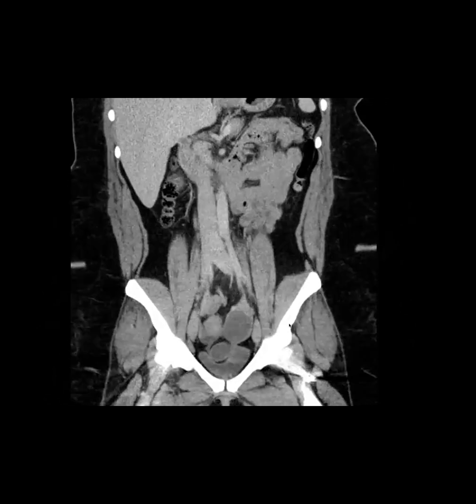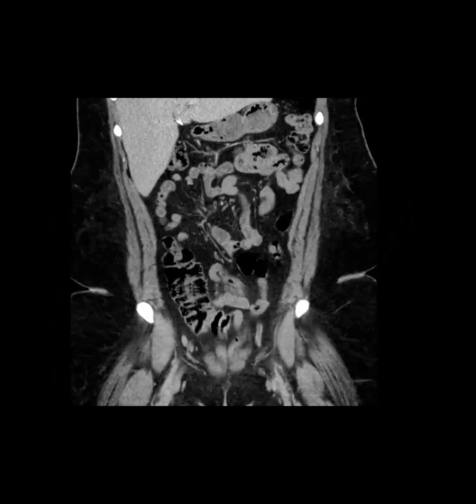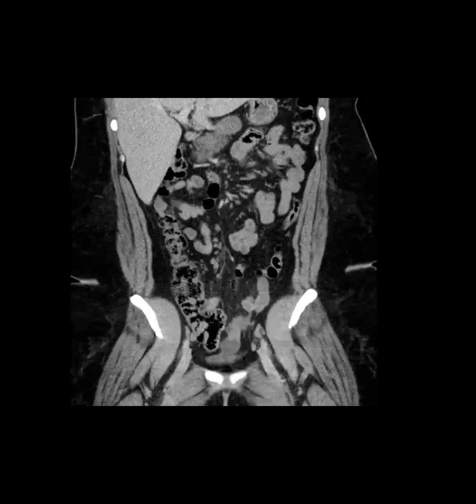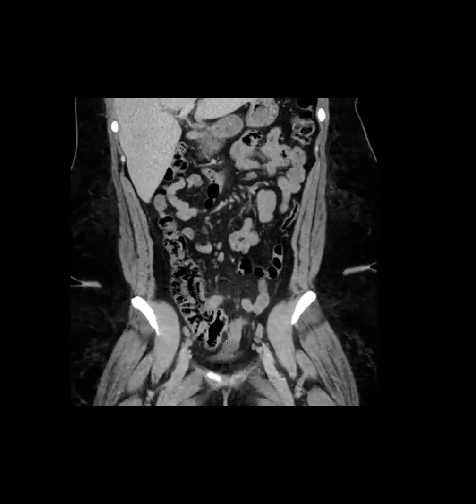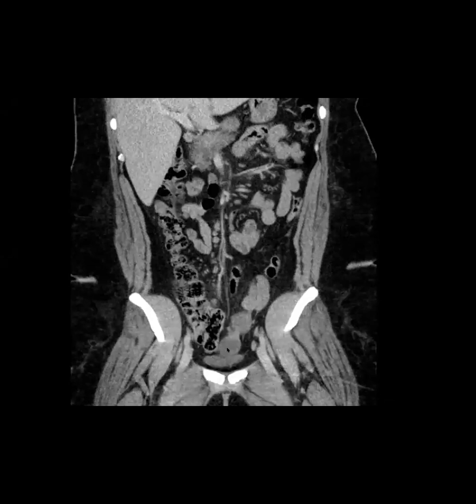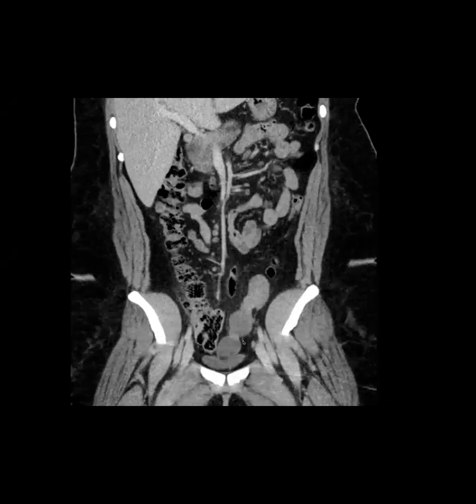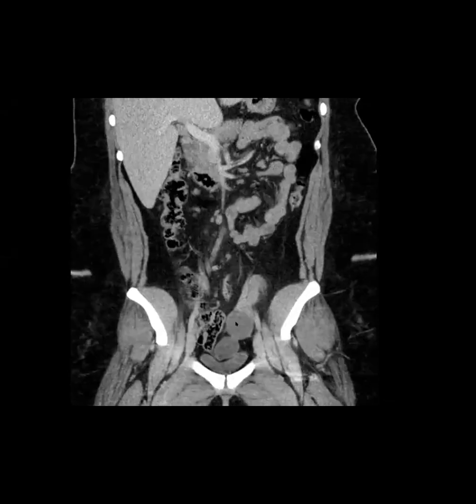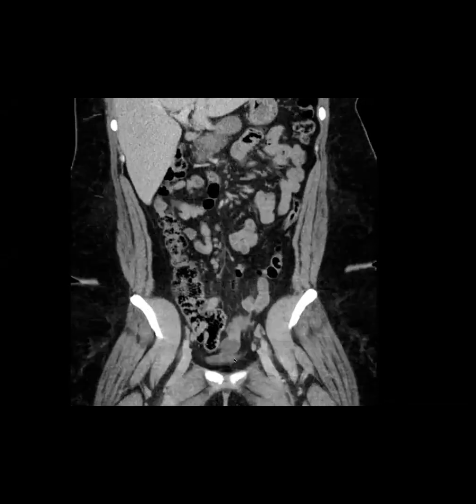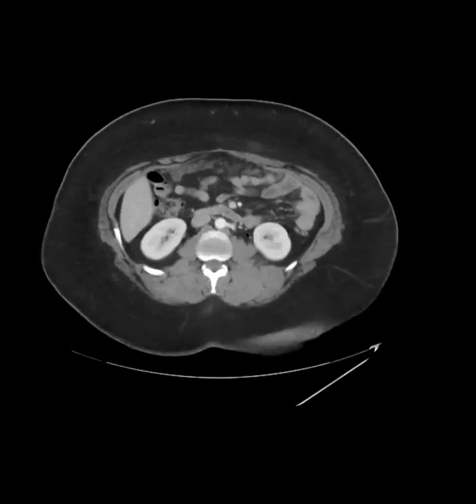So it wasn't called, and then a year later, this is the TI. A year later, her appendix actually looked like this, and you can see that this distal portion is now looking to me like definite engorged, probably with mucin, but there's this definite soft tissue component here, which is different than the usual mucocele, like the low-grade mucinous neoplasms. So this was also, I think, mistaken for bowel, and then she had this ovarian cyst next to it, and so it also was not called here. And then unfortunately, by the time it was detected, it was metastatic here.